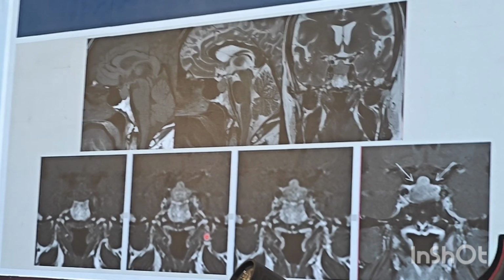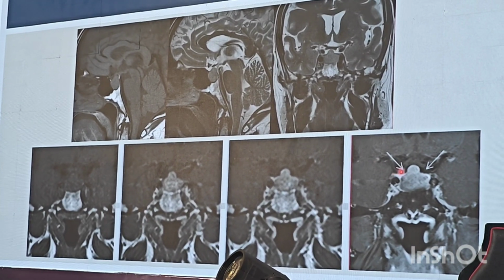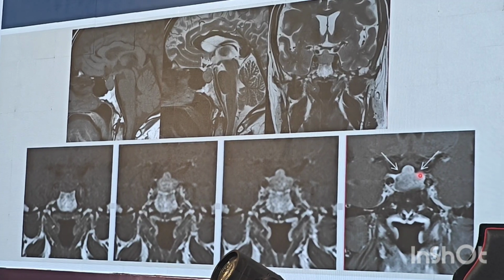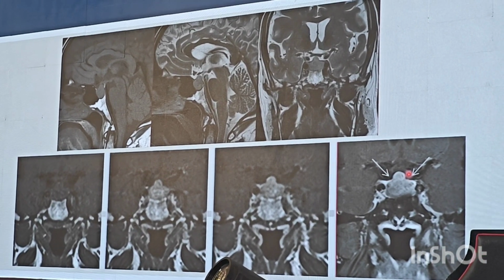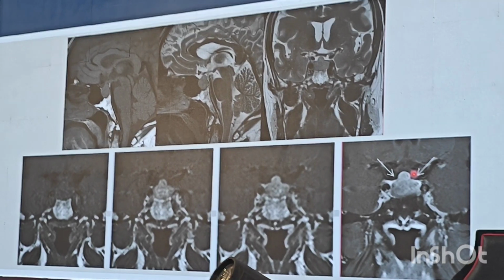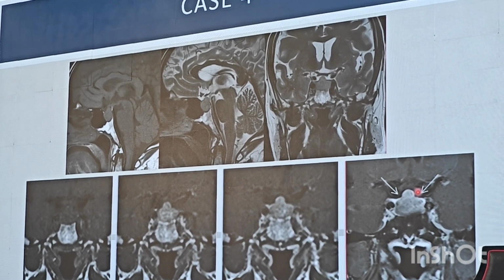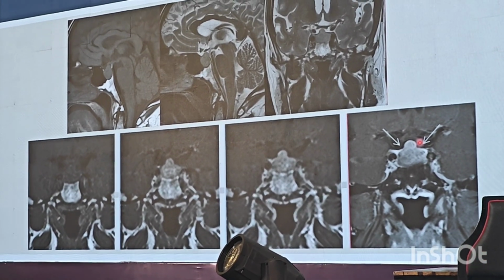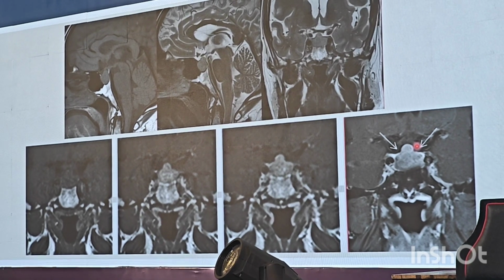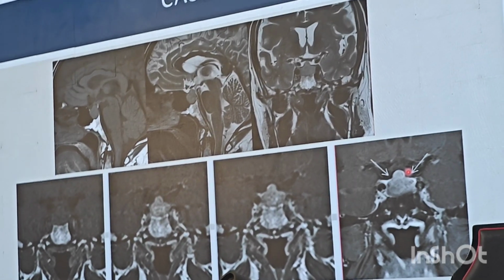And then on your post contrast, the point which I want you to pay attention to is this little notch. If you notice, on both sides of the pituitary there is a notch. This notch is because there is a diaphragma sellae which I told you. The pituitary tumor is a soft tumor. When it goes through the diaphragma sellae, it produces this little notch. And why it is important, you will see, right? So this is more than 10 millimeters in size. What is your most likely diagnosis?